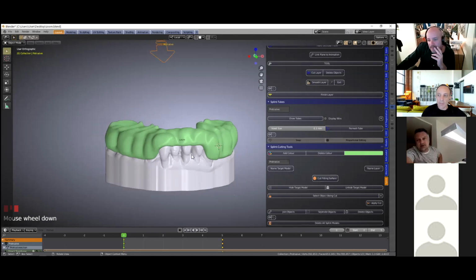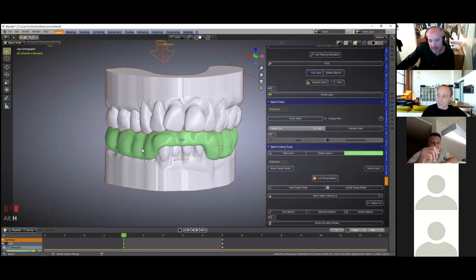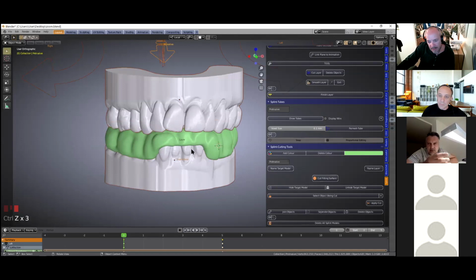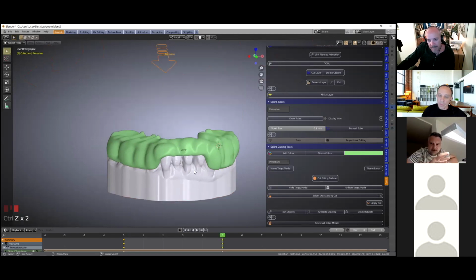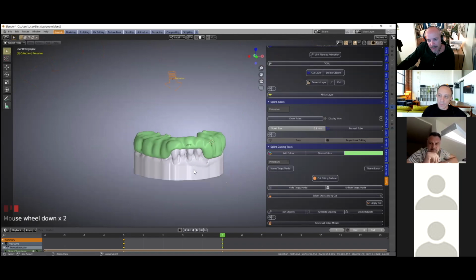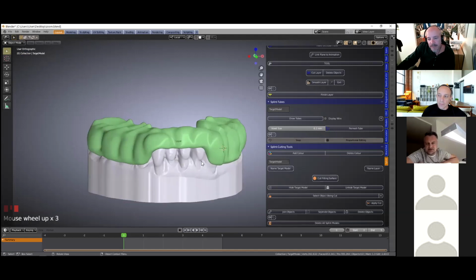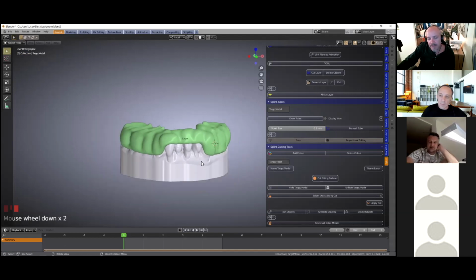Yes, correct. And the last part you are doing, you are defining a new layer, so to say, which is the previous model. So the main model minus, yes, I understood why. The procedure, yes. Cool.